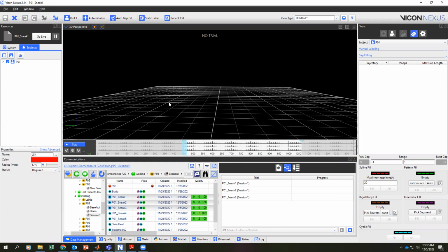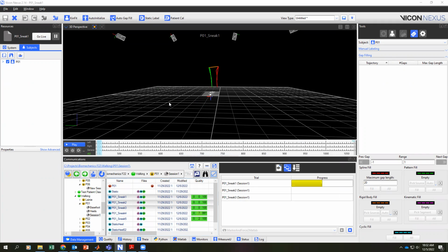And again, in this case, that's all it's doing. It's not going to modify any of the data that I have adjusted. And so this is the advantage of this over the example for batch, is that I can clean things up. And then when I run this, it doesn't lose that cleaning that I had done when I export to Matlab. And again, that's helpful for me to be able to do.